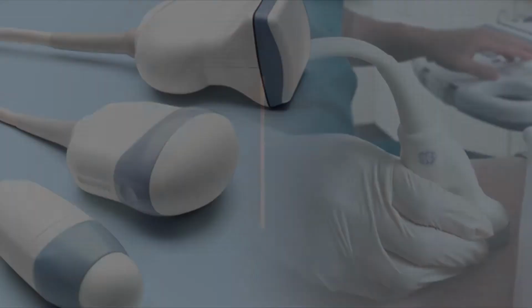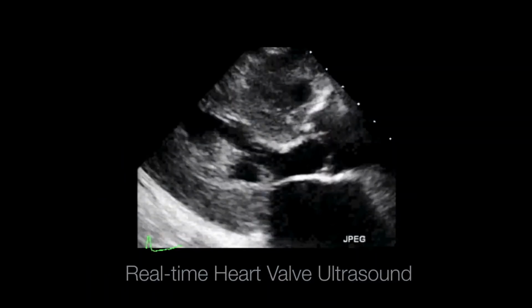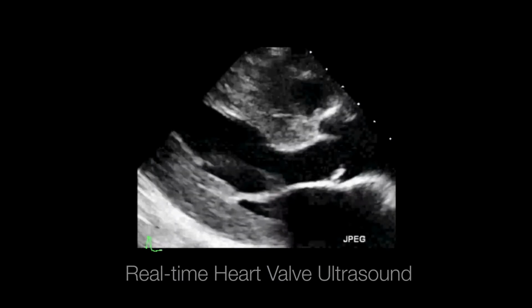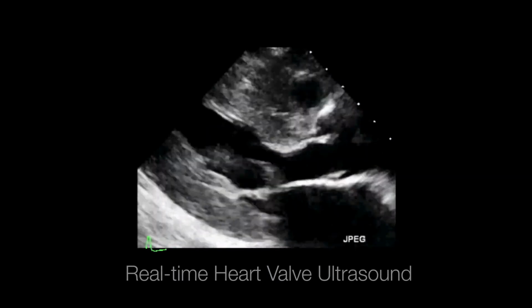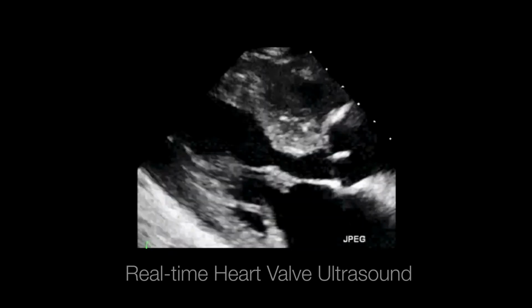A medical transducer contains a large array of crystals which allow it to make a series of image lines that together form a complete image frame called a sonogram. The process is called sonography. In addition, all the crystals are repeatedly activated many times in such a way that a complete image frame is formed around 20 times per second, so that real-time motion is displayed in the ultrasound image.